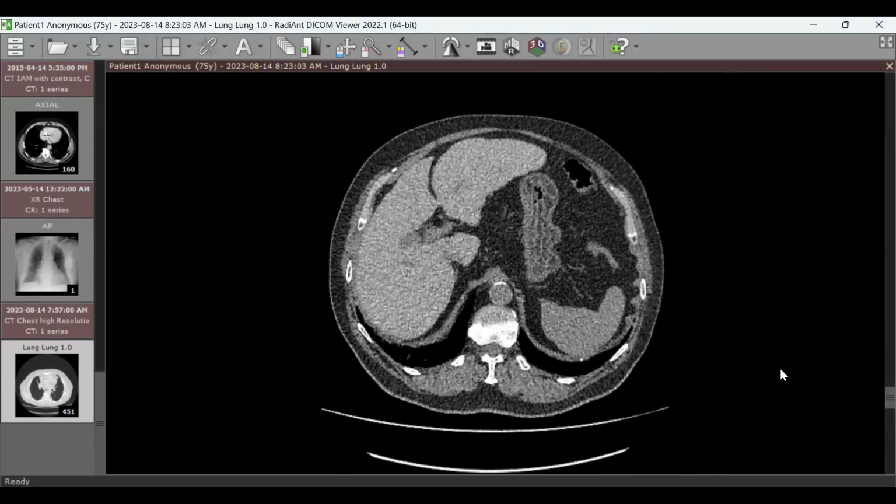Good. That's the contour of the liver. What other elements in liver evaluation can we comment on? Density, hyperdense liver. You can measure the density of the liver.